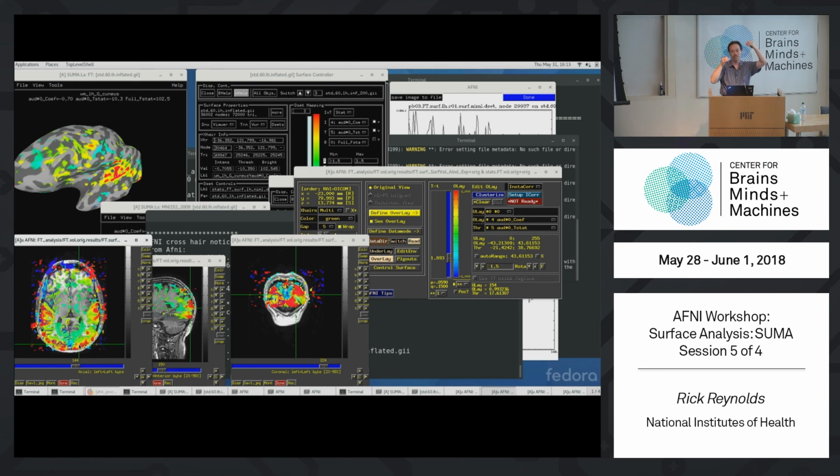So 6 millimeters is kind of an estimate along triangular edges, and it's actually a more complicated computation to keep track of. So blurring on the surface is a little more difficult, and estimating the blur on the surface similarly. This is doing both because it blurs and estimates. So it keeps growing out until it seems like it's locally 6 millimeters all over the place.